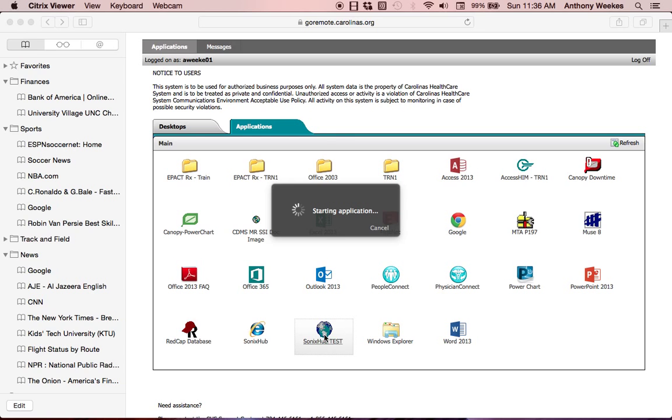And what's going to happen is you're going to use your alphanumeric user ID to log in. Then you're going to put in as your password the word password. When it opens up, you have the option to change the password. We recommend that you use US as your password. So you use your alphanumeric ID given by CHS, and then you change your password to US. So let's wait a little bit for this to pop up. I will start.